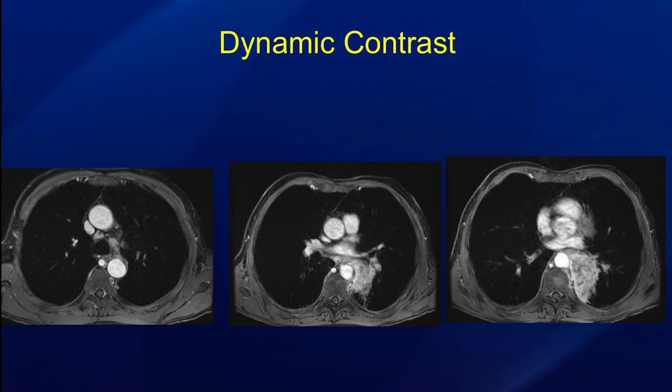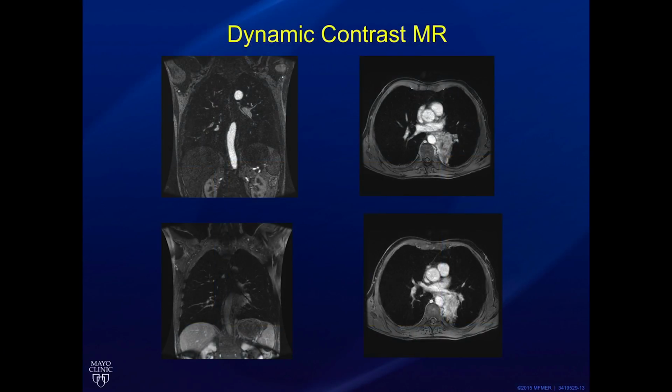All right. So here is some of this dynamic contrast. Again, this shows the images that I did before, just the aorta lighting up, the vessels, and then the tumor. I think I have another better one. Let me just go. Here you go. So this is the bolus, and they sequentially did coronals, axial, coronals, and axials, and I'm not certain why, but I'm certain there's a good reason. I just don't know it. But so here's your bolus image, and it's really beautiful.